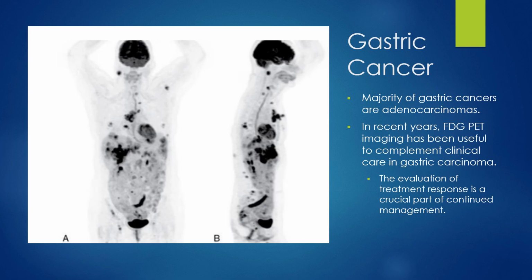And then the images here for A and B are a patient with a metastatic gastrointestinal stromal tumor of the stomach for assessment of treatment response. The scan shows interval progression of the disease with new increasing FDG activity in the skeleton, soft tissue, and liver. You see a lot of it here in the abdominal cavity, in the liver, in the mediastinum. You see some activity up here in the neck. And so this is probably a fairly poor prognosis for this patient.